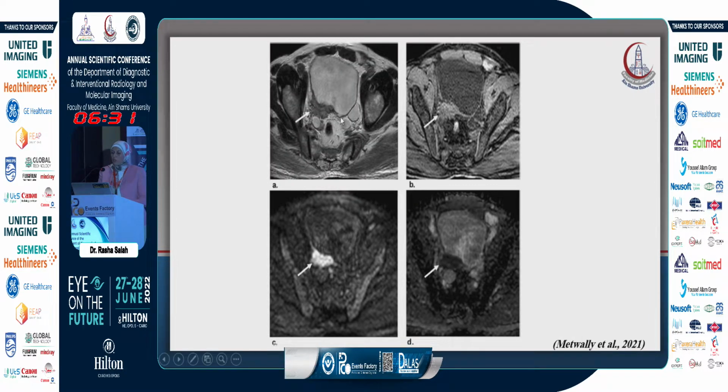This is an example where we can see a sizable extravesical component on T2 weighted image with early enhancement of the lesion noted and the disruption of the early enhancement of the mucosa and submucosa, and this confirms the muscle invasive nature of this lesion. And this was correlated with the diffusion with the corresponding ADC map.